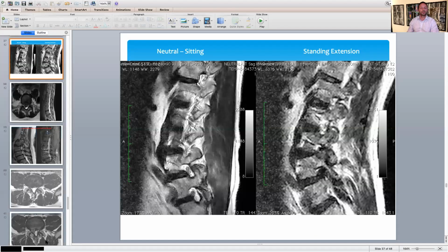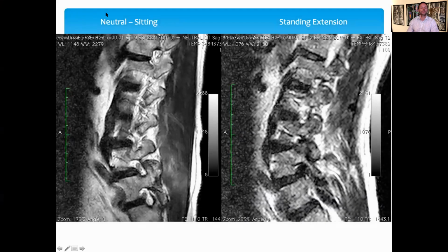So here is a patient that I saw some time ago. Let me just share that for you now. What you can clearly see on this picture, I just want you to look at the left-hand side just here. This is a patient who was 58 years of age and he had suffered sciatica in the legs for a number of years on and off, and it had progressively gotten worse. He'd been to see various therapists and consultants, and there wasn't really any improvement.